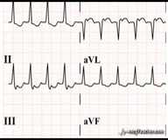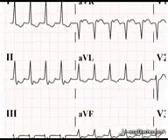As we've seen, this pattern of atrial depolarization supports the contention that the abnormal depolarization focus is junctional in location. At a heart rate greater than 140 beats per minute, the nature of the depolarizing focus within the junctional region is re-entrant.